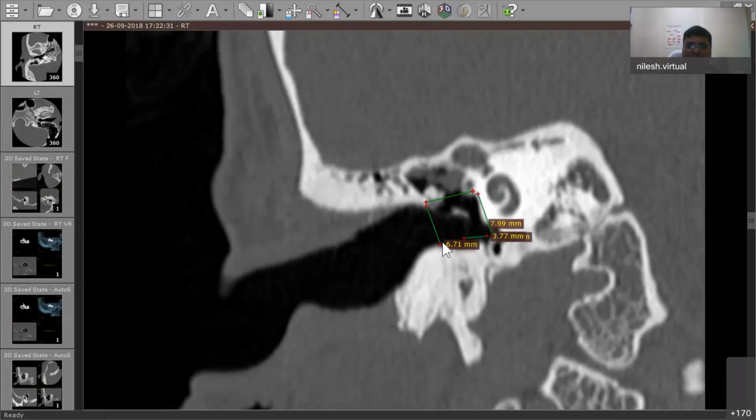So only this box, if you are seeing from the endoscope, what you will think? Handle of malleus is normal, tympanic membrane is normal, middle ear looks normal. Then where is the problem? Patient has presented with the attacks of facial nerve palsy. So facial nerve is somewhere involved. So it can be Bell's palsy also, it can be congenital cholesteatoma also, it can be facial nerve schwannoma also.